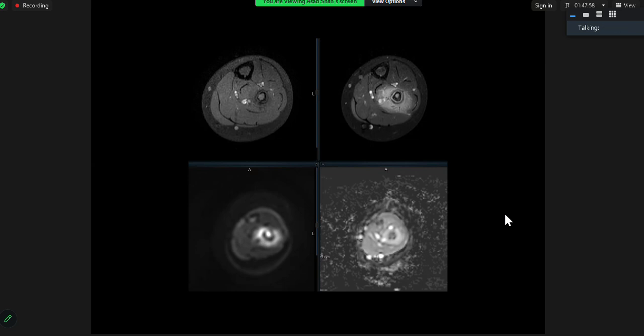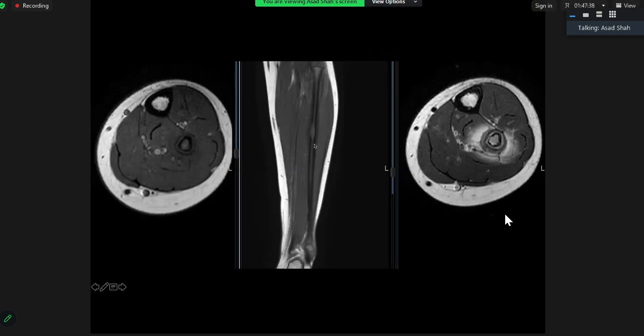Right. I mean, the lesion is there. It's an intramedullary lesion, isn't it? Yeah. All right. So that's the post contrast. Maybe it's not showing any post contrast enhancement. I mean, I should have shown you probably a coronal to make it. But if we go back, do you think it's a cyst on T1 or... difficult? Right. Okay. All right.